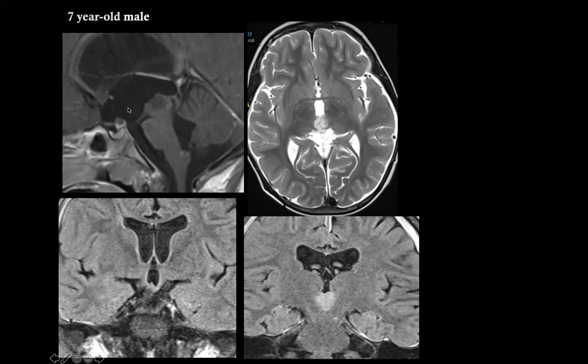And there is also a lesion here. This is a post-contrast scan. You can see some areas enhancing, some areas not. You can take a moment to look at this scan, but it's very important that you know this enhancement, but also that there is something wrong on the clivus. Something is enhancing also at that level. So this is something in a different location. It's not the typical bifocal germinoma. This is metastatic tumor.